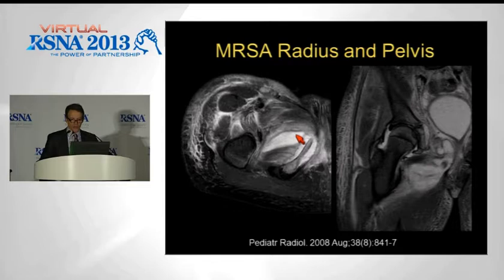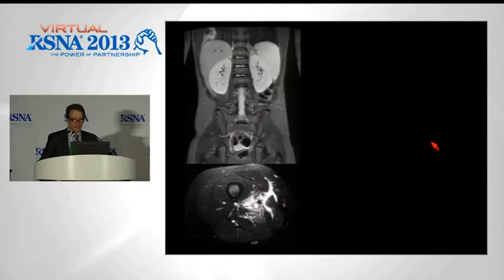But unsuspectedly, when this patient also presented with some findings around the hip, and the hip was actually imaged, we saw that there was extensive purulent collection that went from the inguinal region and went into the pelvis, displacing the bladder and also having subperiosteal infection.